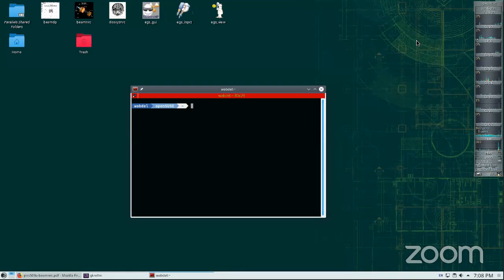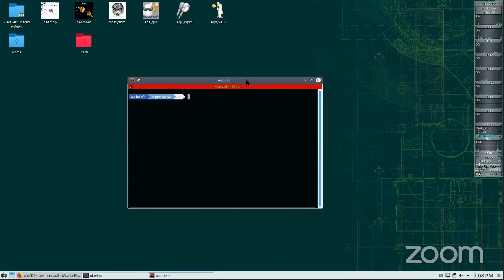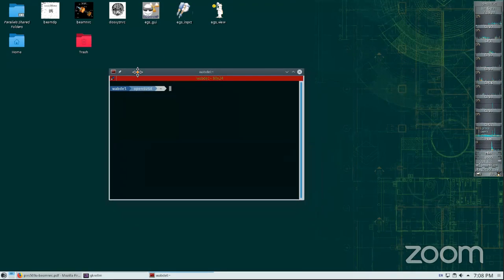With the dose RZ, we said that we were limited to probably just calculating doses across the beam central axis because the rest are rings. And usually, at least from my interest, to calculate profiles and so on, I cannot use the RZ geometry, but I can do this with the dose XYZ geometry user code.